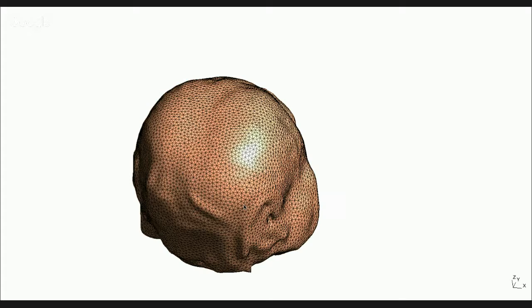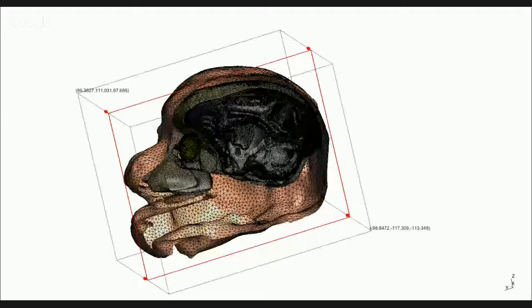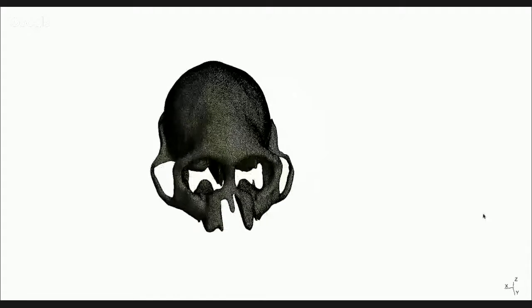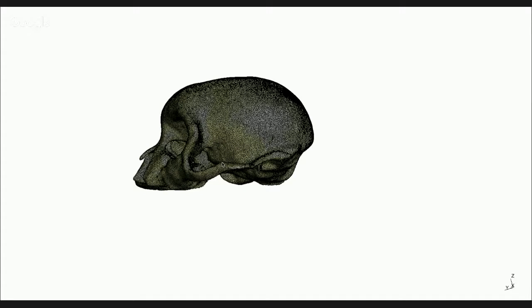So that would be now a model from a monkey. It just shows a skull, a monkey skull, for example. So basically you can do whatever you want in terms of visualization. In combination, you can also display scalar entities, vectors, even tensors. In combination with models, you can now also integrate imaging from fMRI. I guess that was about it, what I wanted to show you.